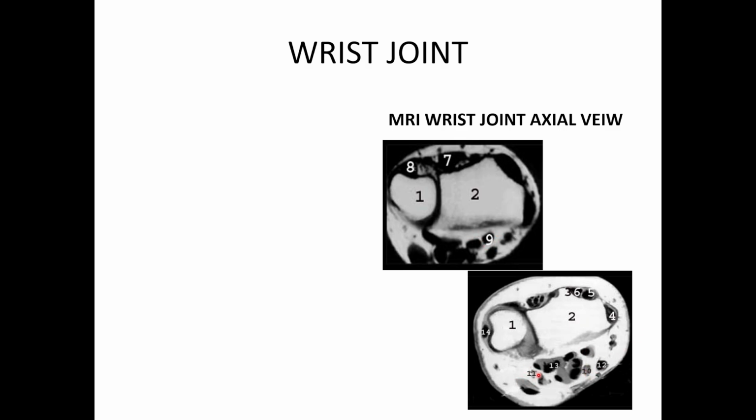11 we have the ulnar nerve. 12 we have the flexor pollicis longus. 13 we have the long flexor tendons, and 14 we have the extensor carpi ulnaris.